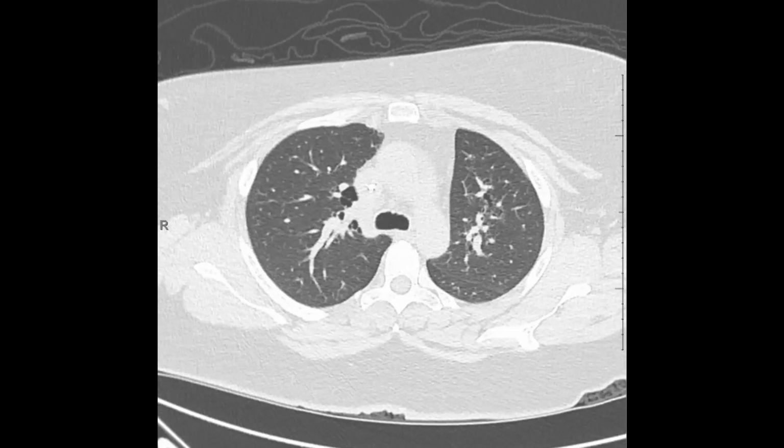And so this patient ended up having an overlap syndrome, or previously someone would call it an overlap syndrome. And so I think most people would now call this IPAF, so interstitial pneumonia with autoimmune features. Some people call this so-called undifferentiated connective tissue disease.